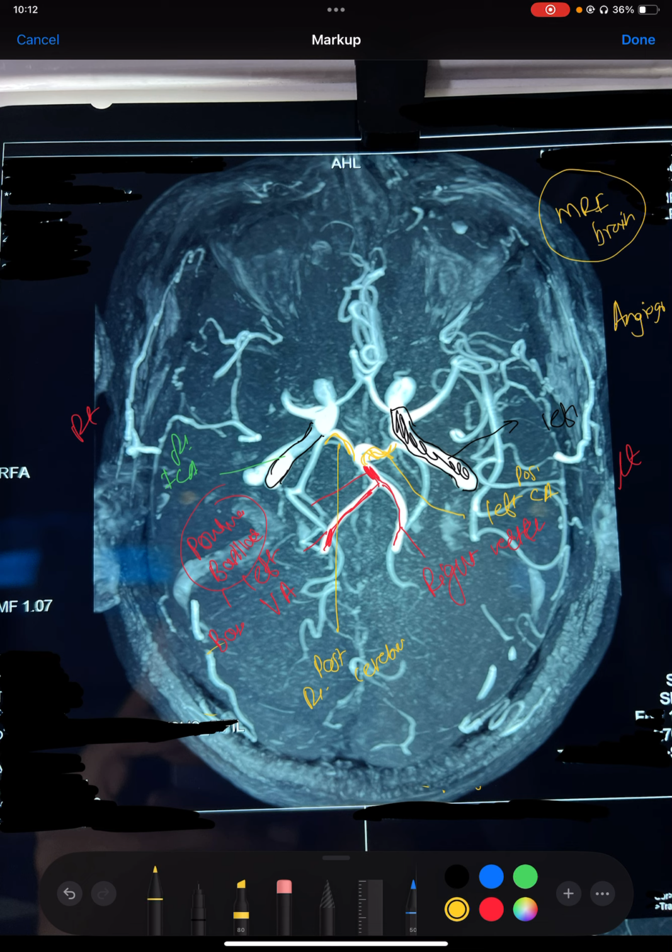After that, this is the right middle cerebral artery. This right middle cerebral artery divides into so many branches, which we can very easily, very nicely make out. There are so many branches going up to the periphery, which we can see here, here, and here. It is so well perfusing all the brain, and these branches are going up to the deepest portion of the brain.